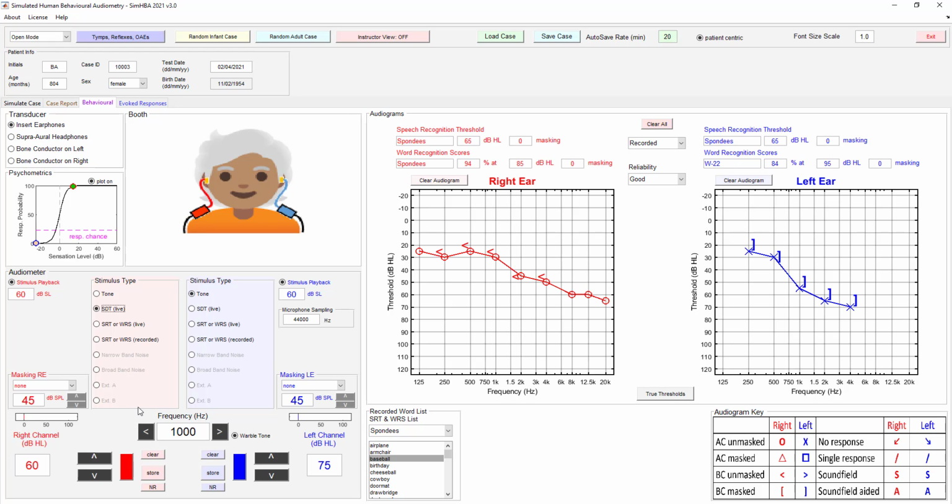So let's give this a try. We're going to use an example of baseball here and a recording of a live baseball. And the patient detected that. And you can see underneath there was the VU meter, which showed my speech going up to a peak of 60 dB and fluctuating based on the phonemes there.